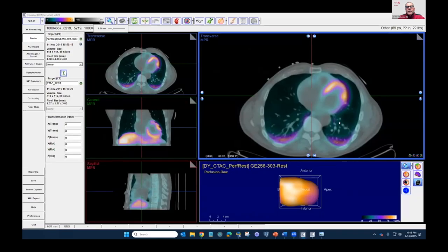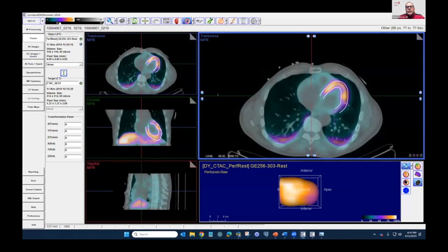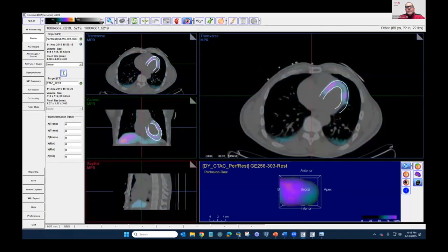I know on some of the SPECT imaging stations, the vendors actually provide a contour around the PET activity, and that can be helpful, as you can see here as well. So if you decrease the blending there, Moaz, you'll see that white contour is definitely outside in the lung, right? And so that can be a helpful adjunct for the technologist.